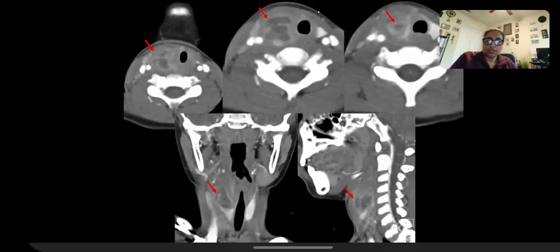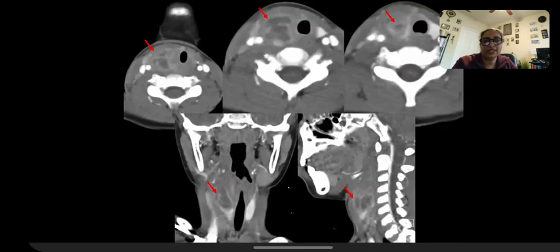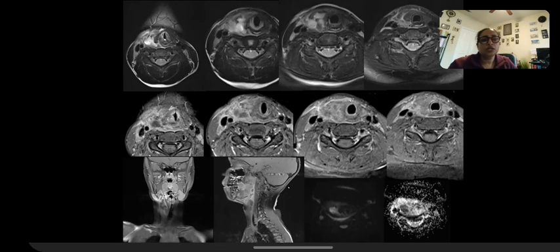Okay, now coming to the next. Okay, so I think this is another patient or the same patient. I don't remember, but here you can see the same concept, right-sided. This is actually on the right side, which was the other one that also was on the right side that I showed. It's the same patient. So here you can see again that right perithyroidal/intrathyroidal abscess. You can see that extension superiorly towards the piriform sinus, and you can see that that abscess is kind of restricted on the diffusion weighted sequences. So very classic infected type 4 branchial cleft cyst.